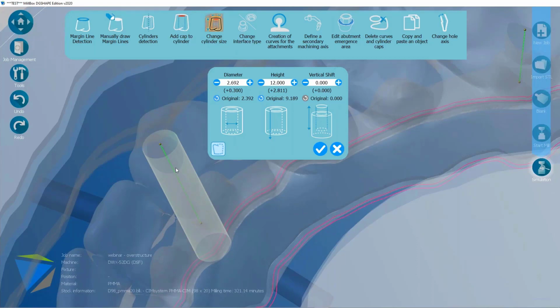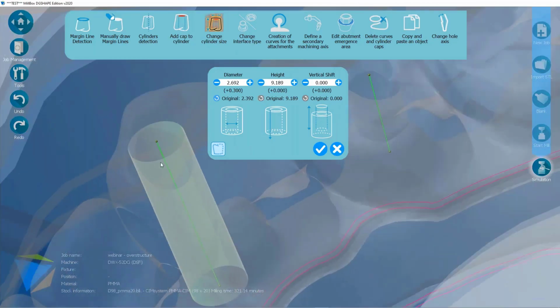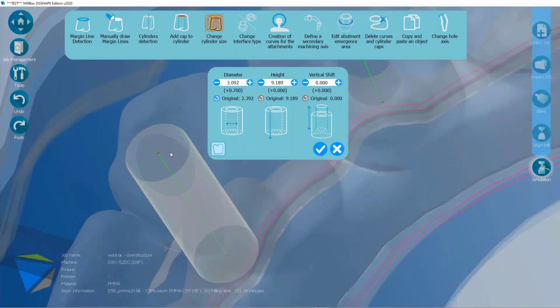But here you can manage a different value and then restore the previous one. However, this is a way you can quickly change. It's very comfortable because, for example, sometimes you may have the problem that the designed hole is too small because of bad design or whatever, or maybe the tool is too big to enter inside this hole. So you can fix it on the way by simply enlarging it.